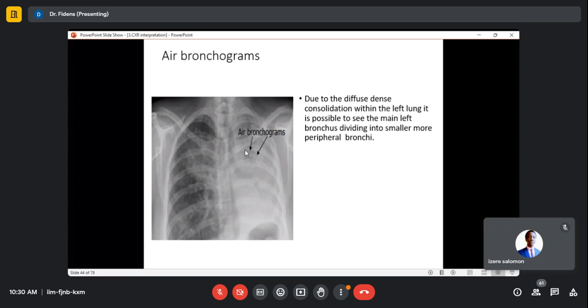But the way the trachea is deviated, at that level, it is too much to be explained by this rotation. Another reason may be this opacity that I consider as a mass, maybe pushing on the trachea. That's maybe another reason. And the third one, which I don't believe much, but may be possible, I don't know, is if there is any kind of lung fibrosis in this opacity pulling on the trachea. Those are three possible causes of this tracheal deviation.